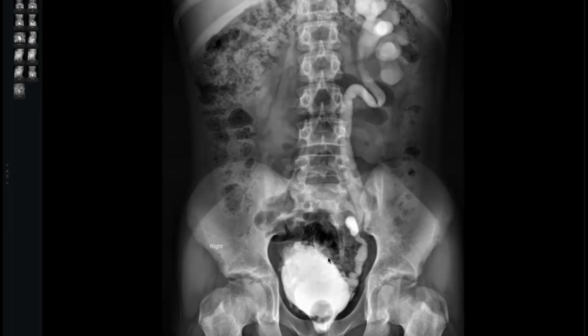Either you are dealing with posterior urethral valve or you are dealing with Christmas tree of neurogenic bladder. Next, look at the bone. There is a defect. This is a neurogenic bladder. So in two steps, I think here also in L5 there is another spinal defect. So in two steps, we diagnose it.